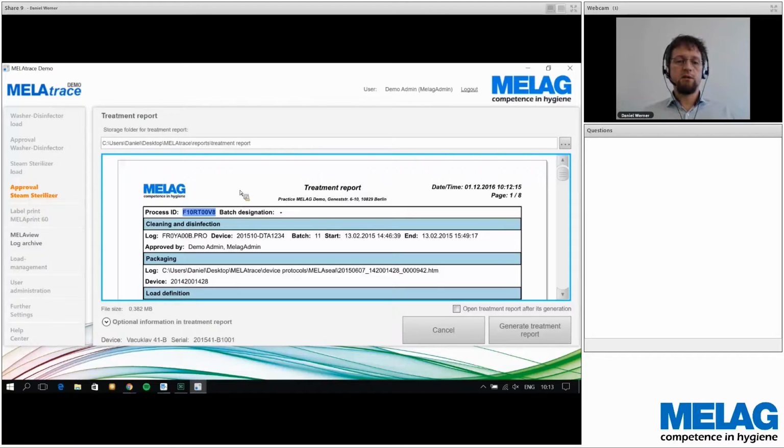I get the next question. Released successfully. Do you want to print labels? Yes, of course, because I have wrapped items and I have to mark them. Click on yes.